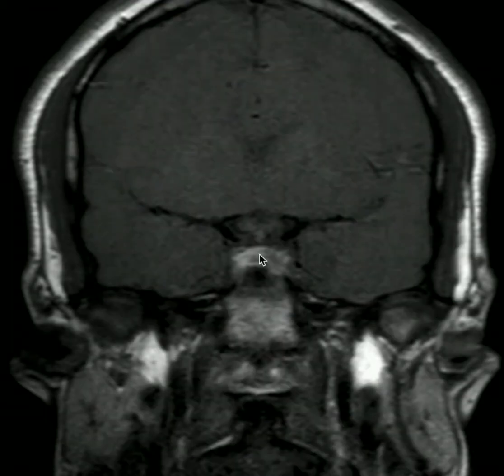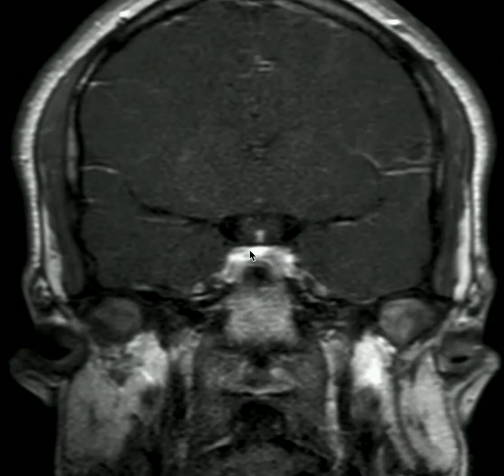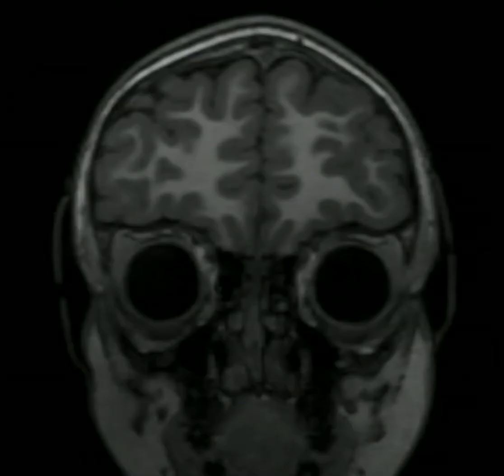Moving forward to the first time point, we see enhancement begin throughout the posterior pituitary. Moving forward just a little later, we see avid enhancement in the infundibulum. As we go further forward in time, we notice the enhancement here becomes more homogeneous. All this is a normal pattern of enhancement based on dynamic imaging. We expect the enhancement to start at the posterior pituitary and to quickly spread to the infundibulum because these areas get arterial supplies. In contrast, the anterior pituitary gets a supply from the hypophyseal portal system and therefore will enhance just a little later.